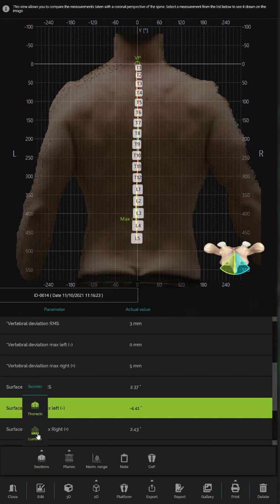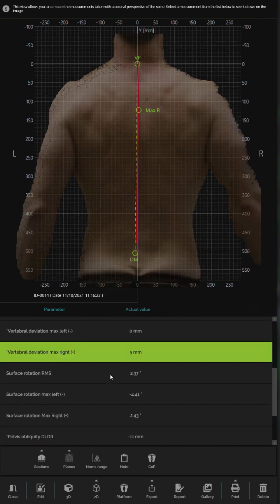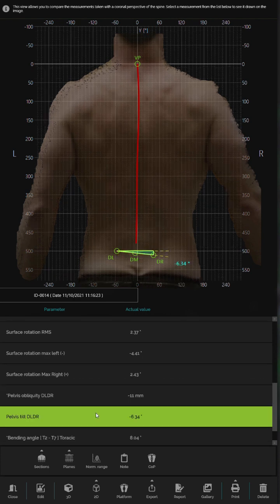But you can sometimes see that the spine is getting in the way. When you take this section off, you can see there's a clearer amount of rotation in this area, and a counter rotation higher up. You can remove the thoracic. And whilst mild, this gentleman who has a physical job, his symptoms do correlate with the thoracolumbar junction. It does actually completely match.